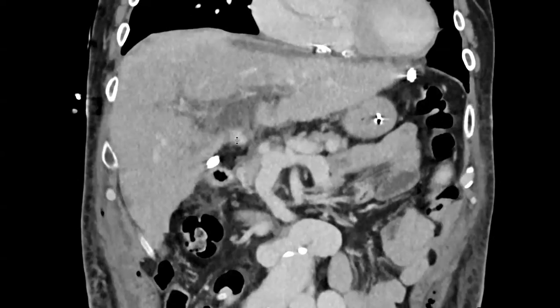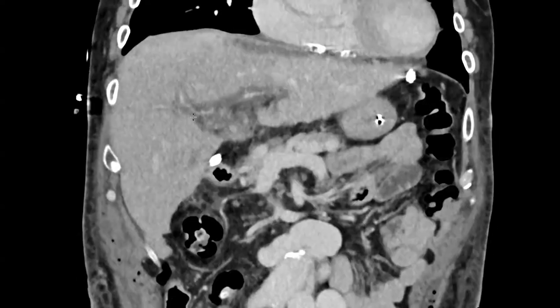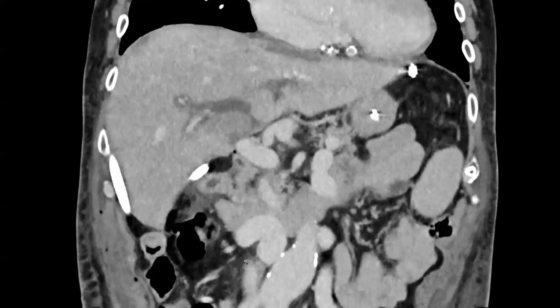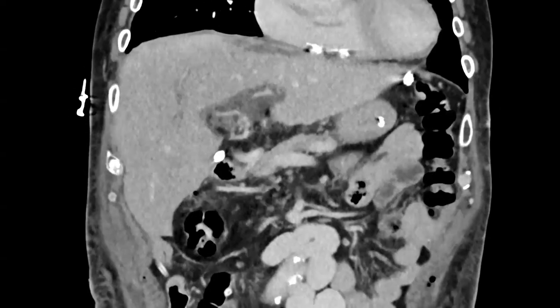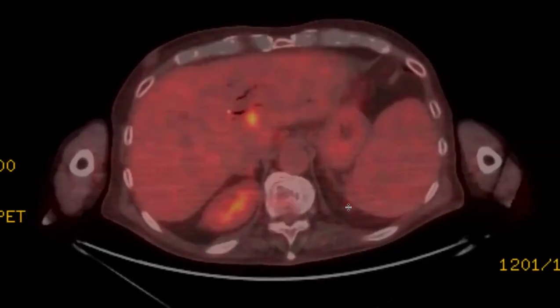So yeah, the portal vein is a little bit, the left is not really there. The right is maybe here, but there's definitely narrowing here. This is post-op. You can see the surgical drain is still there. That's wild that this is immediate post-op. That's very weird. Yeah. And then I'm going to give you the... It must be some kind of ischemic thing then. Oh wait, here's your, no, PET.